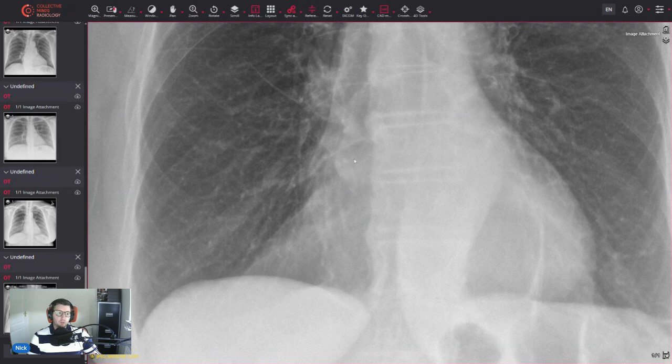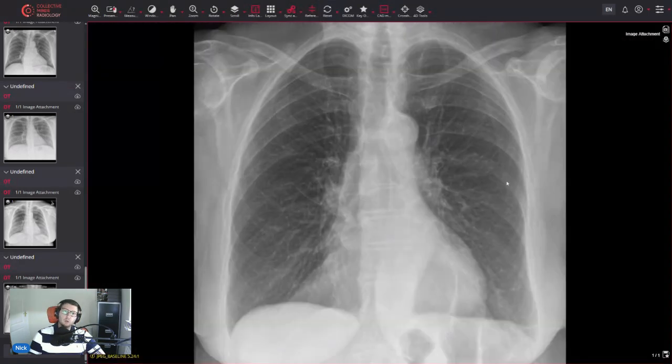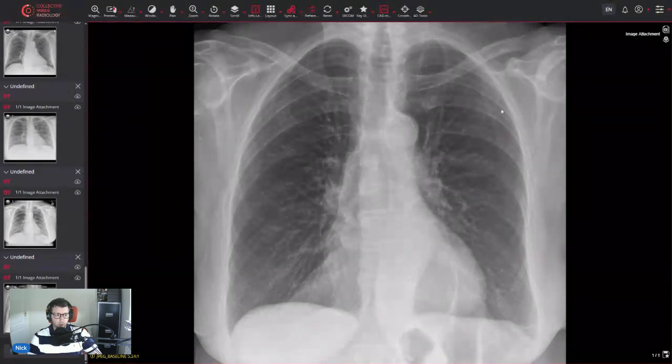It can be more difficult to differentiate between a pericardial fat pad and right middle lobe collapse. We can faintly see some right heart border beyond it though, which you wouldn't see with right middle lobe collapse, again because of that silhouette sign, because of the way that the middle lobe sits up against that heart border. If it collapses against it, it would completely obscure it. If there's any doubt, I've seen follow-up imaging performed in the past for fat pads. You can check with previous x-rays obviously as well to see if there's been any change there. We do have some linear atelectasis there incidentally, post-inflammatory scarring of no clinical significance. The rest of the lungs look fine.